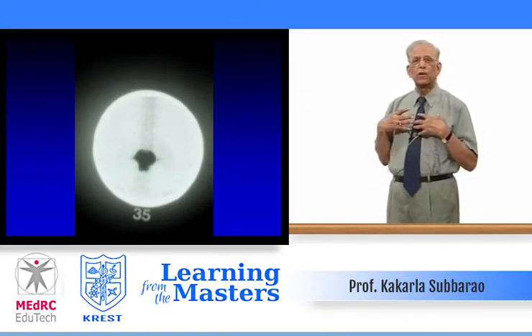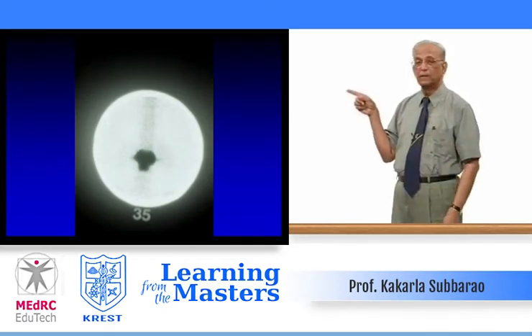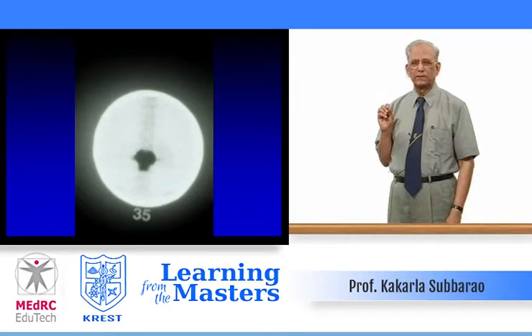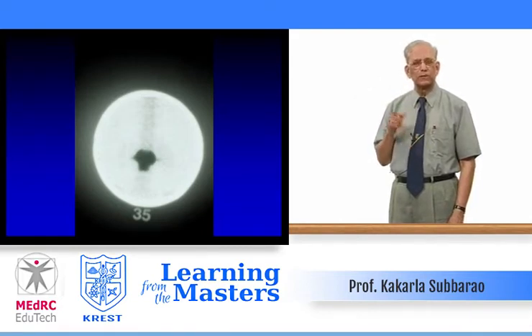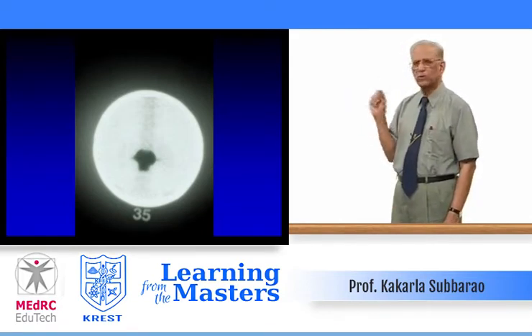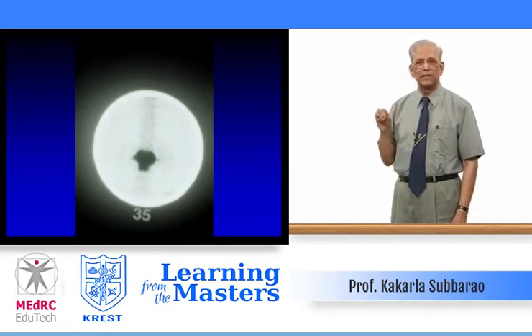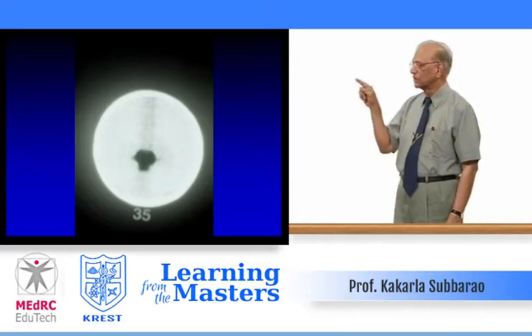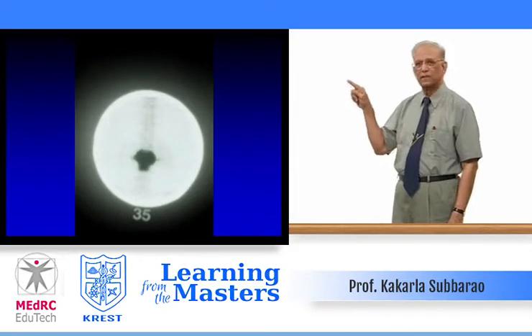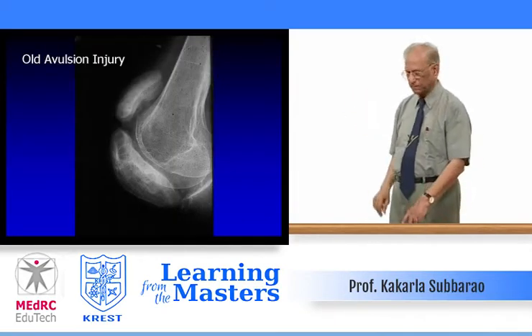And so far we have not described that the sternum is involved. Here, it is very often difficult to take a radiograph of the sternum. If you take a lateral view, you don't know what is exactly happening in the body of the sternum. So often, the most sensitive method is using a radioactive isotope like technetium-99 and using the gamma camera and taking a scan. Here, you could see the shape of the manubrium sterni nicely, sharp margins. This is Paget of the manubrium sterni.